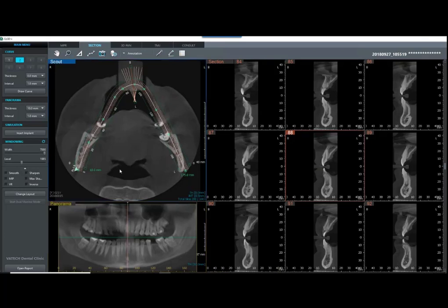Right. And we could extract that as a separate pan JPEG image as well. Right. We definitely could, yeah. So that's another way to reconstruct your pan out of this image.